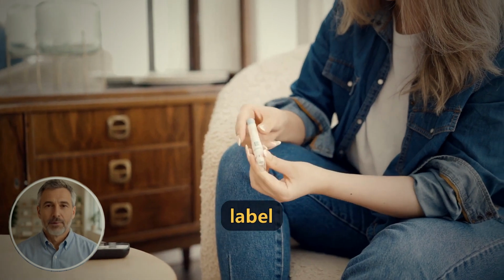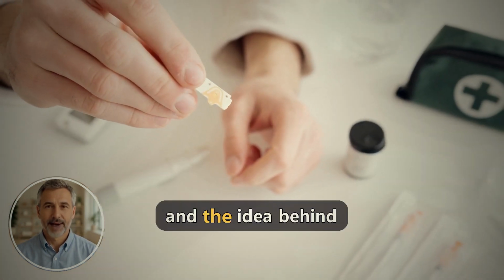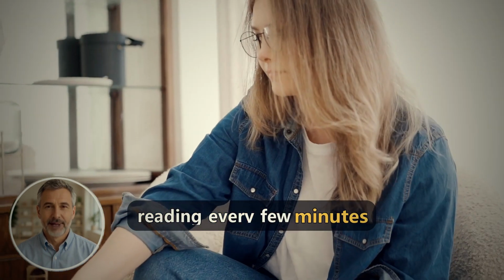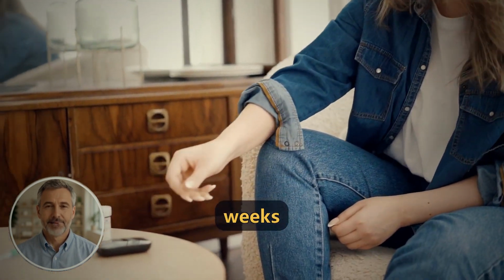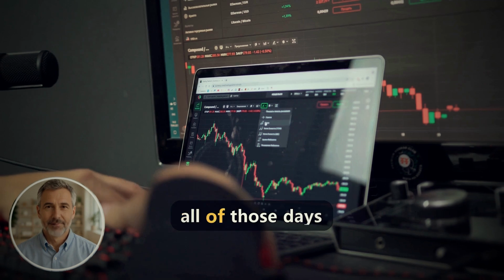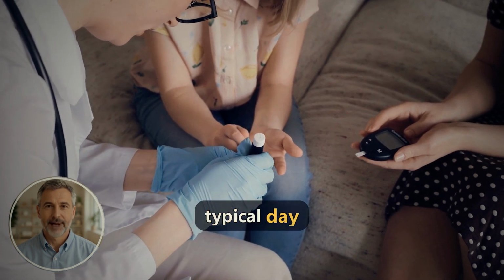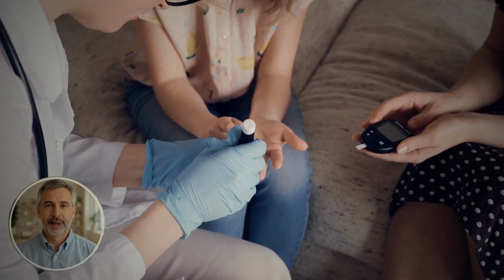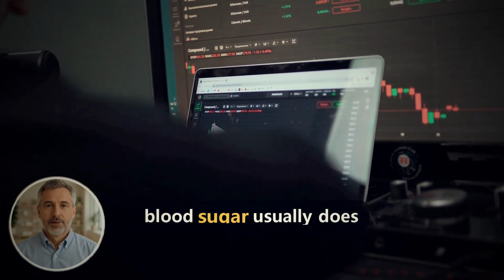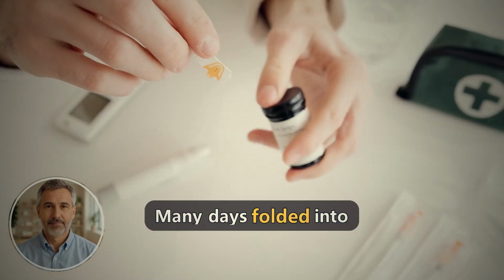Start with that scary label, AGP. It stands for Ambulatory Glucose Profile, and the idea behind it is genuinely clever. Your sensor takes a reading every few minutes, all day, for a couple of weeks. That is thousands of numbers, way too many to read. So the report takes all of those days and stacks them on top of each other into one single, typical day, from midnight to midnight. Instead of 14 separate messy lines, you get one clean picture of what your blood sugar usually does over 24 hours. That is the whole trick. Many days folded into one.